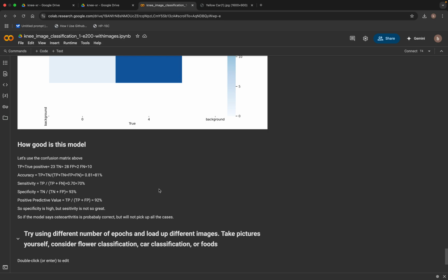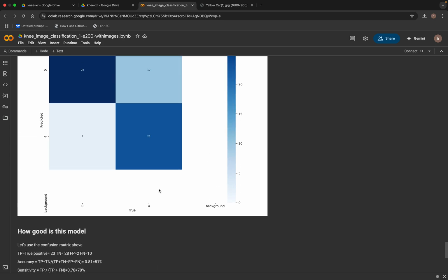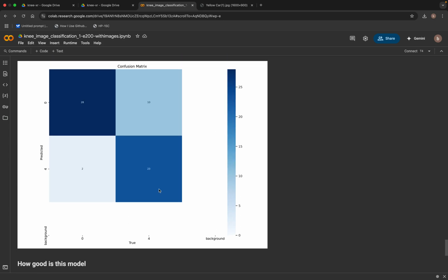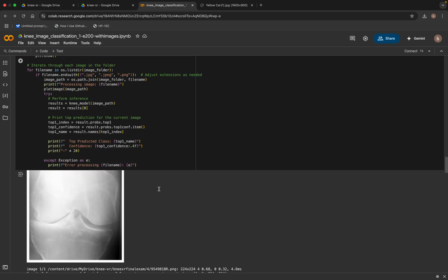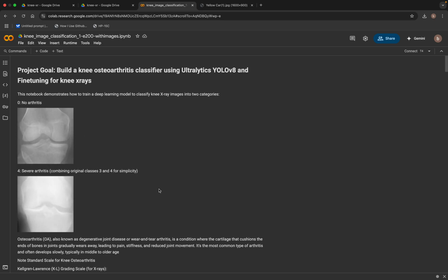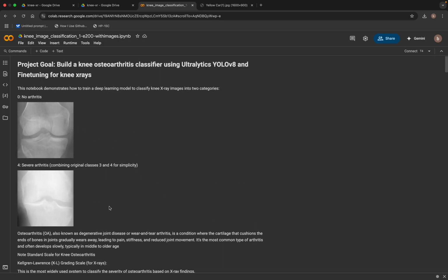And so I really encourage you to play with this. Hopefully this is helpful for you, and it teaches you how to use a simple vision model, how to fine tune it, and then create a classifier. I found this really appealing, so you can see real images and see how it does, and it should be pretty easy to use.